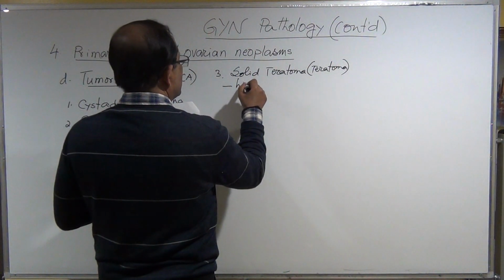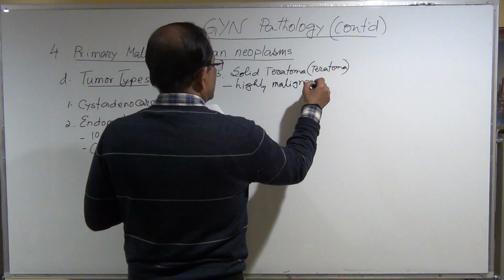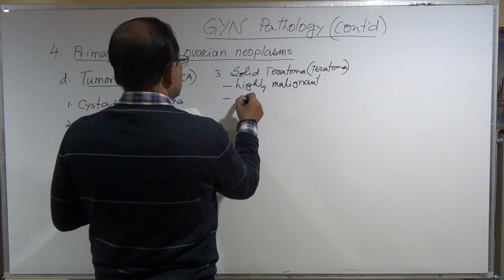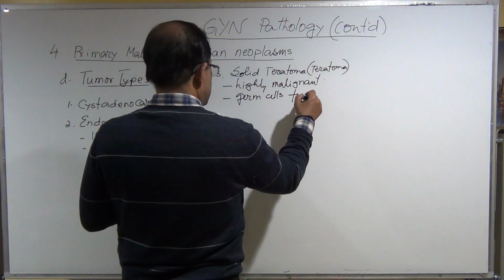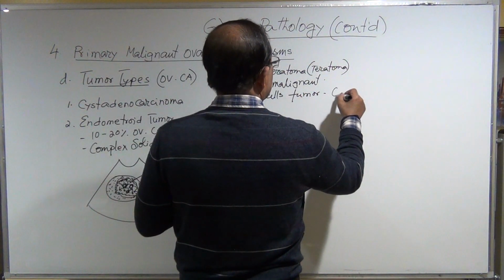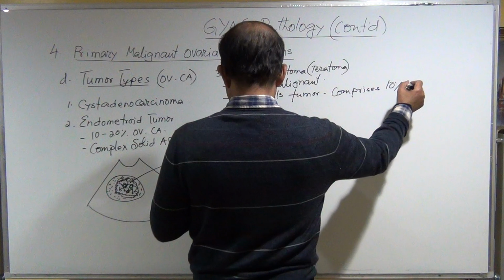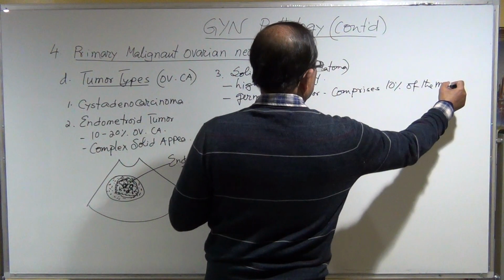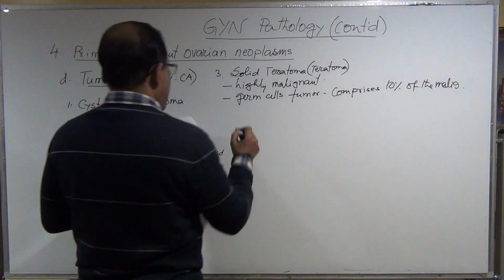Highly malignant, and it is a germ cell tumor that comprises approximately 10% of the malignancies. 10%. And it appears hyperechoic.